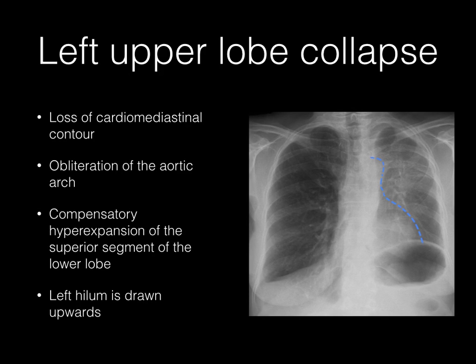The left upper lobe collapse, on the other hand, usually results in a very thin sheet of collapsed material, and this particular pattern is very difficult to interpret because as the left upper lobe collapses, it collapses anteriorly and forms a thin sheet of tissue opposed to the anterior chest wall. Therefore it doesn't result in the classical dense opacification but results in a hazy veiling opacity extending out from the hilum and fading out inferiorly. It obviously results because the left upper lobe is a significantly large structure anteriorly.